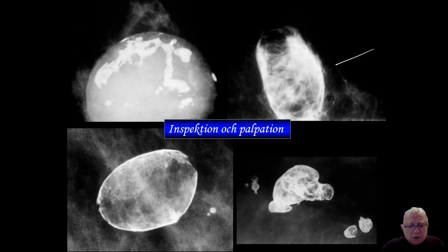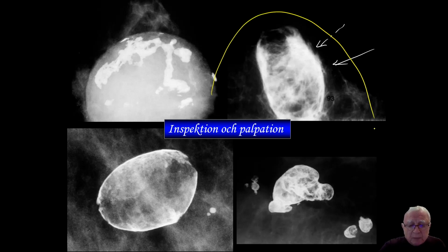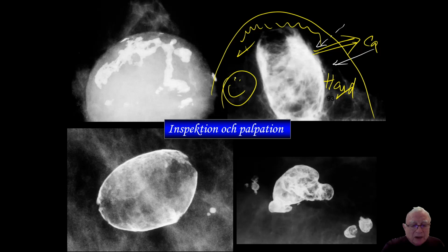Now come doctors into the picture. Some women want to have larger breasts, or this could have been the result of breast reduction surgery. You see the oil cyst. It's actually scary for the physical examiner because it's very hard, and also the skin may be retracted. These two, hard lump, deformed skin, immediately lead the thoughts to cancer. And then the radiologist says, no, this is post-traumatic fat necrosis.